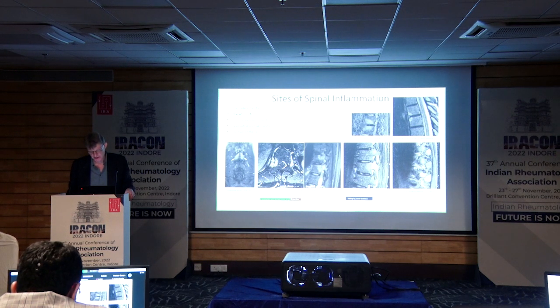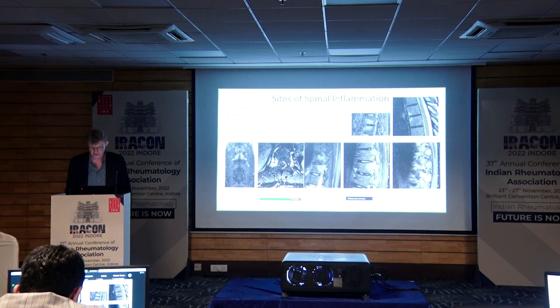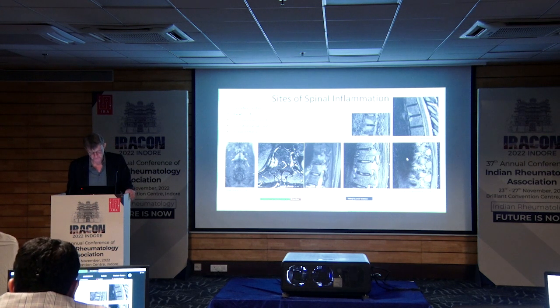This is facet joint inflammation, I've shown you an example of that. And this is where you go so far lateral that you only have the transverse process at the rib. And these are too bright, while this one is looking normal. This is also too bright. So those are the things you would look for.